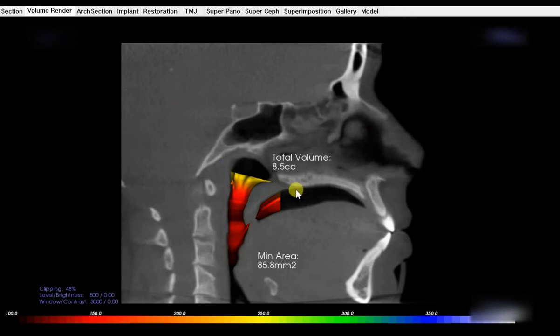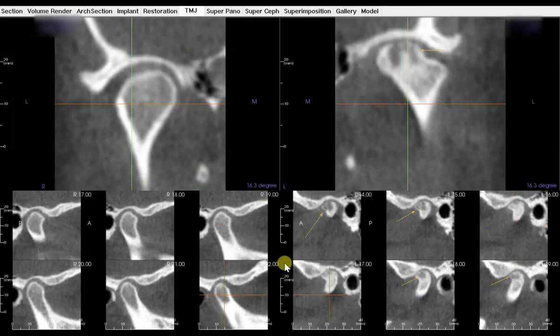But when the oral maxillofacial radiologist was reviewing the report, I happened to look at the temporomandibular joint, which is an essential part of looking at the whole anatomy captured in the scan, and this led to the discovery of some changes on the left condylar head.